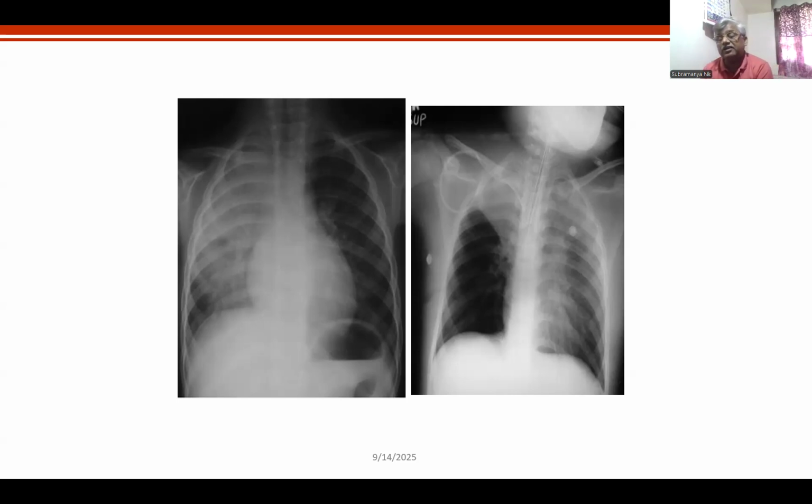If you look at the right upper lobe collapse, it is a small volume of lung. Lower lobe collapse means a big volume of lung. Did you understand my point? So be careful. Whenever you are looking, you should have that physics in mind. What is the volume that is affecting the drifts, shifts, or the amount of compensatory hyperinflation?